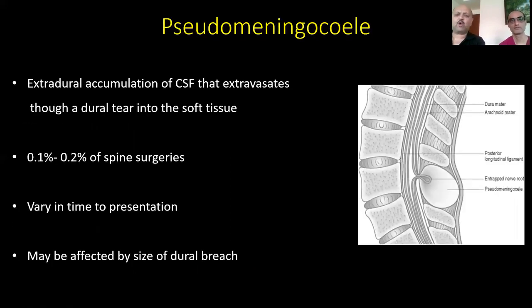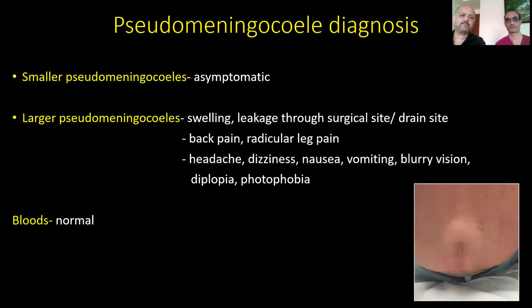The next swelling we talk about is a pseudomeningocele, an extradural collection of CSF that extravasates from an intraoperative dural tear. It can vary in time to presentation. Some pseudomeningoceles, especially from a large puncture, can present almost immediately post-surgery within a matter of days, and some may present over a matter of weeks to months if it's a very small breach.